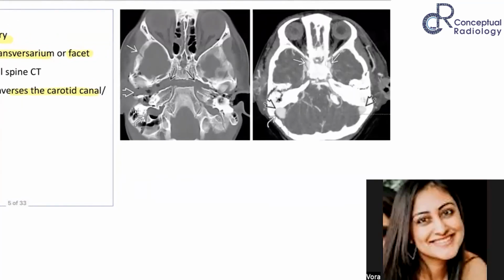So you can see how the carotid artery is seen here. You can see that the transverse sinus is intact. So even though there is no vascular injury here, you want to do a CT angio to rule it out. I will repeat the diastatic fracture part when we get to fractures. Basically, this is the body of sphenoid. This is the clivus.